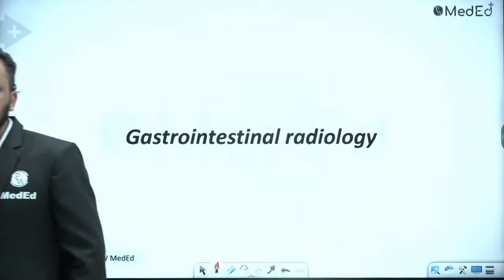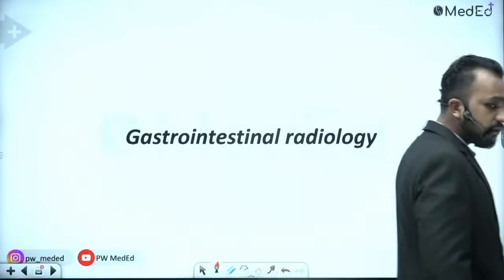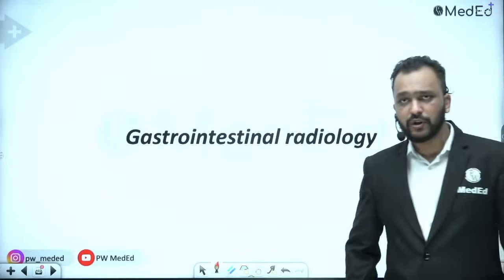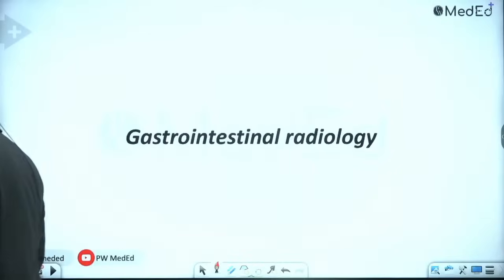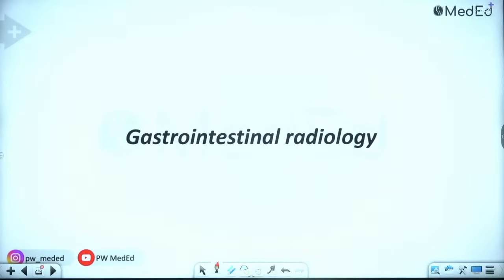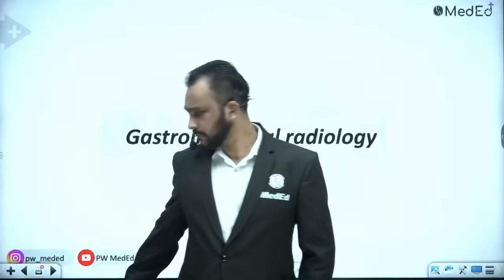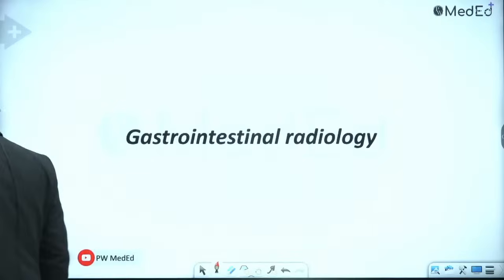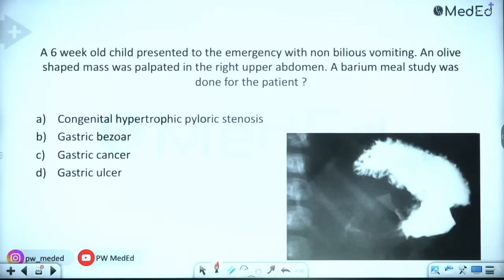So guys, we are done with chest radiology, we are done with neuroradiology. Now we will have a look at a few images in the section of gastrointestinal radiology, right? So let us begin. Okay.